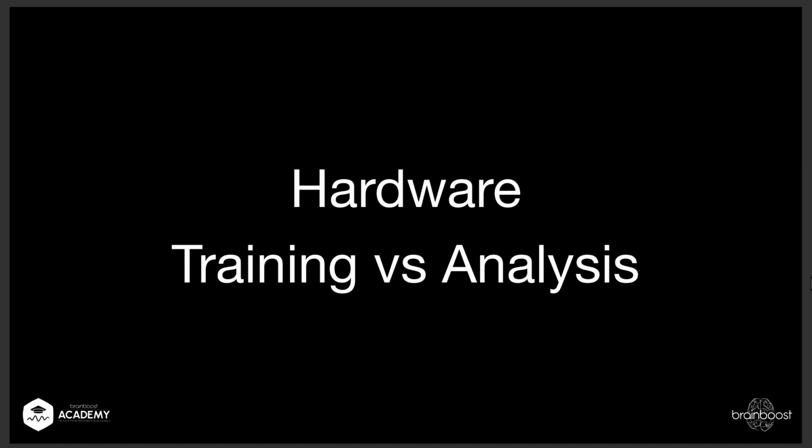So some people might think, if I only have 8 channels or 4 channels, can I even do an analysis? Yes or no? Of course, if you have 19 plus channels, then you can do a more intense and deeper analysis. But here are different ways in this webinar how you can use our auto report with a different amount of channels.